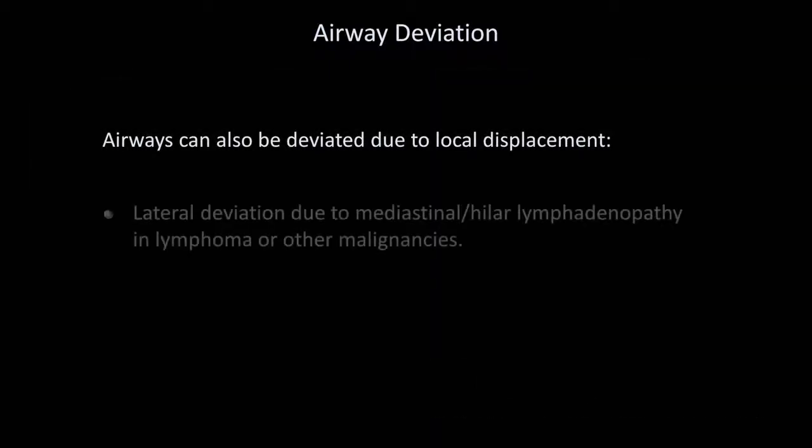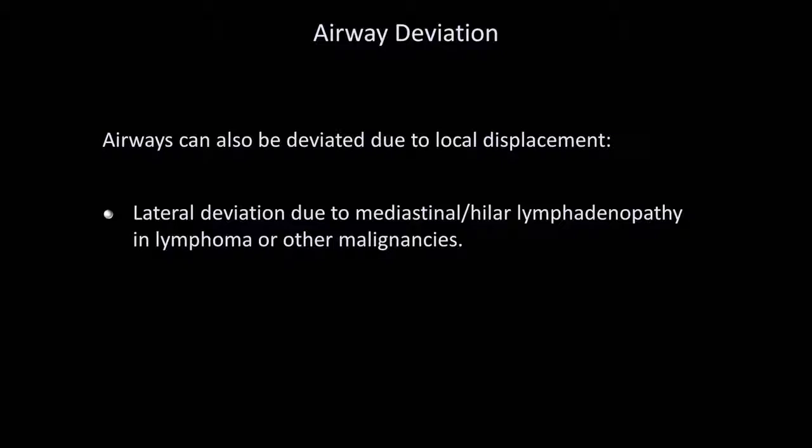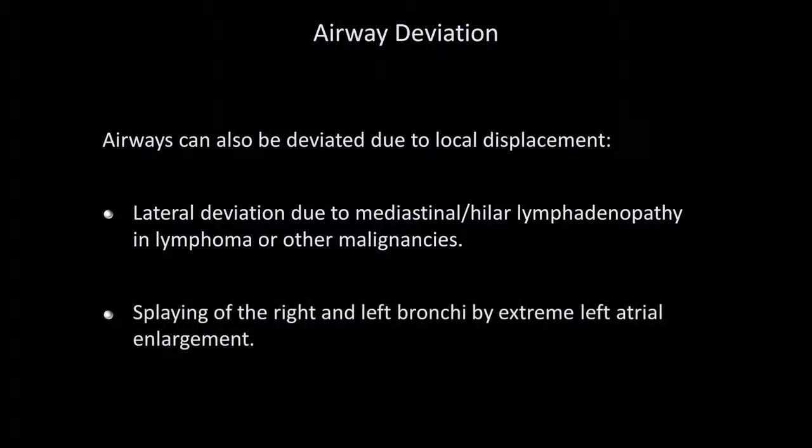Airways can also be deviated due to local displacement. There can be lateral deviation from mediastinal or hilar lymphadenopathy in lymphoma, or a mass from other malignancies. And there can be splaying of the right and left bronchi by extreme left atrial enlargement.